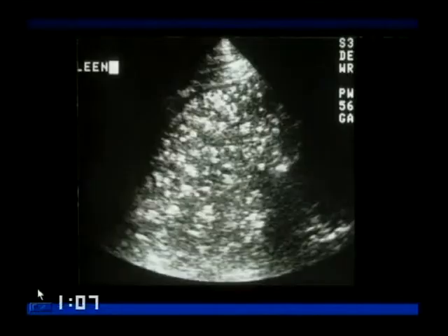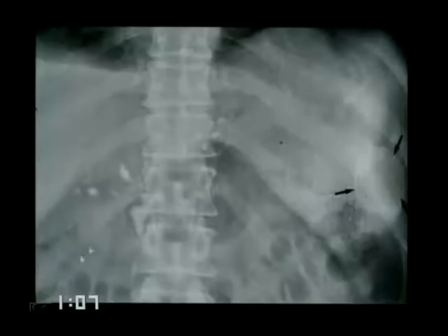Everybody's seen granulomata in the spleen, but maybe you don't remember seeing one on ultrasound this profound. Just multiple foci, many with shadowing throughout the spleen, and this should be granulomatous disease, TB, or histo, or brucellosis, which is what it is.